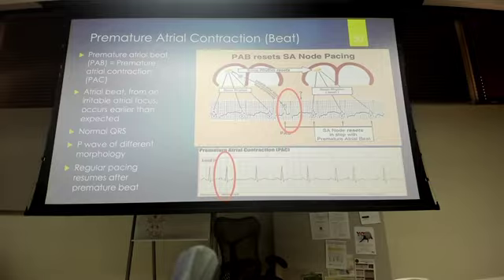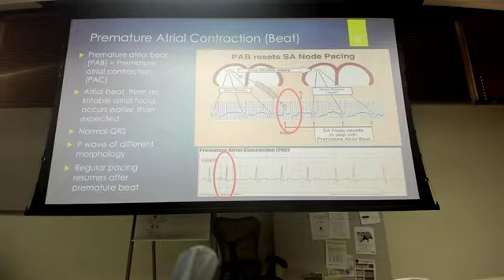We've got another example here. We look at this P wave and this P wave. We are looking at our rhythm. It says, look at the P waves. Do all P waves look the same? They should look the same. And if they don't look the same, now we have to figure out the rationale. Why don't I have that? If you look at that P and you have an associated QRS complex, are those QRS complexes marching out? For this one, it's occurring earlier. We march back here, march this out, it's occurring earlier here, and it has an abnormal P wave associated with it. No, it's an atrial beat because it has a P wave.